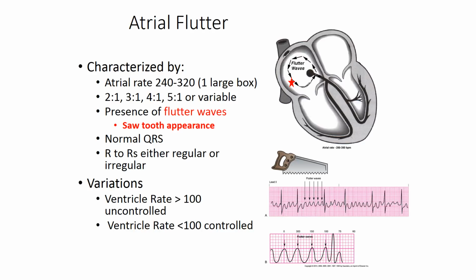So your main takeaways are that this is an atrial problem, so we won't have P waves and we will have F waves instead. And our QRS will still be within the normal limits, less than 0.12 seconds, because we don't have a problem in the ventricles. We have a problem with ventricular response. So our ventricular response might be regular or irregular, but likely very fast.